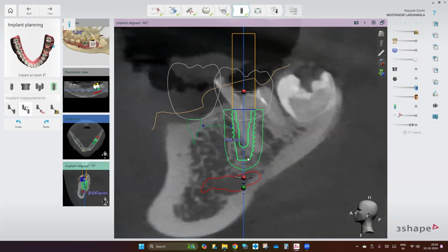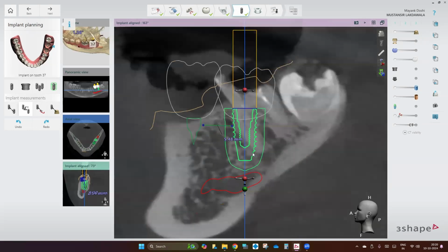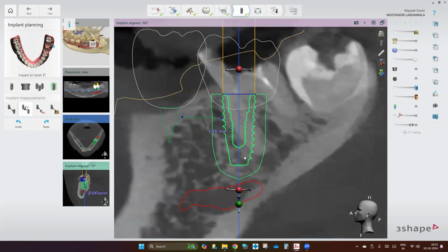The good part is, with this position you will come out in the absolute prosthetic center in future, and you will not have to worry about primary stability because it will come from the entire engaging of the mesial wall, the apical third in the mesial bone, and the entire coronal third of the furcation.